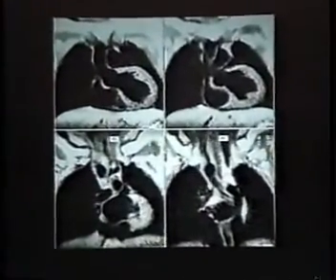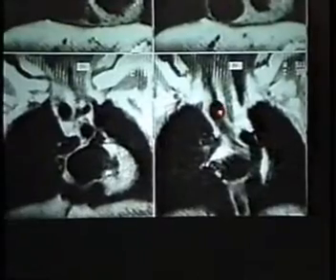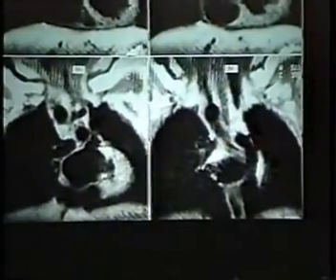Let's read across. Origin from the left ventricle, ascending aorta. Ascending aorta giving rise to a carotid, pulmonary artery, aorta, tracheobronchial tree, passing here next to the right arch. Right arch, see some subclavian here, right arch. The next image, we can see the right arch passing behind the esophagus, tracheobronchial tree to descend on the left side, and origin of the left subclavian from this ductus diverticulum.